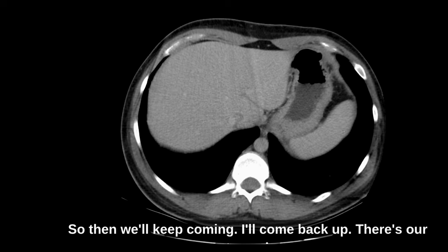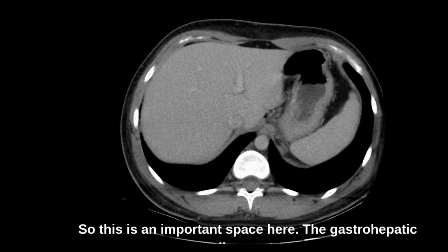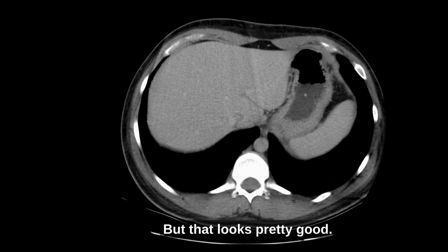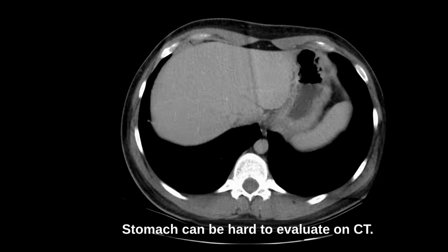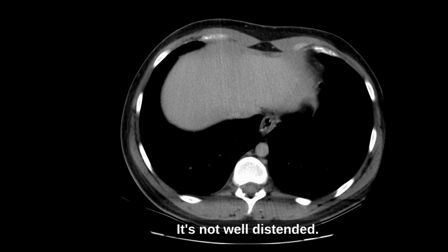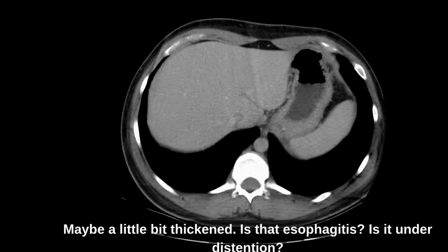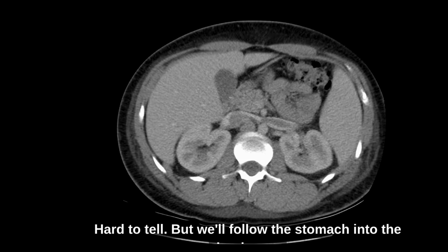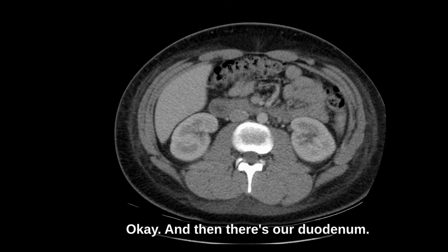So then we'll keep coming, we'll come back up. There's our stomach. So again, spleen, stomach, liver. This is an important space here, the gastrohepatic ligament. Sometimes you can get lymph nodes or fluid in there, but that looks pretty good. Stomach can be hard to evaluate on CT. It's not well distended, but it's looking pretty good. There's our distal esophagus, maybe a little bit thickened. Is that esophagitis? Is it under distension? Hard to tell, but we'll follow the stomach into the duodenum.